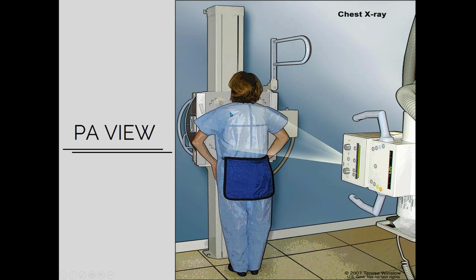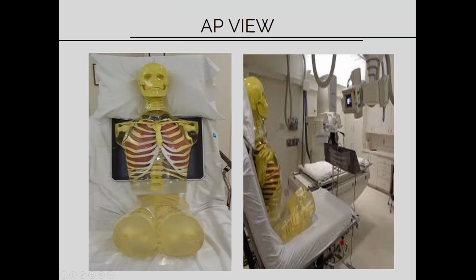Okay, and in that case we have to maintain the position of the arms so that the scapulae are away from the lung fields. Okay, and that is the reason that in these x-rays the scapulae are away from the lung fields, while the AP view is actually for trauma patients, ICU patients, for any patient who cannot stand.